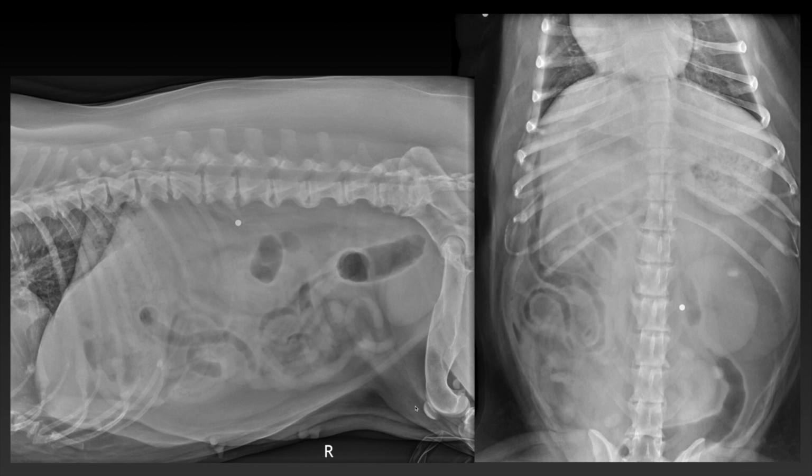The projectile is not associated with any soft tissue changes or reduced abdominal details, so it's also considered an incidental finding, and the position of the projectile could be determined also during abdominal ultrasound. The significance of the lumbosacral findings has to be evaluated clinically, and the fracture is healed, but the cortex did not finally reform, which will probably happen within the next weeks.